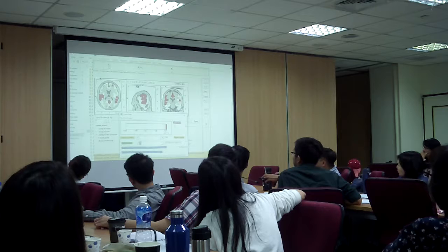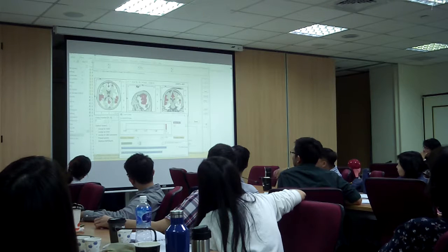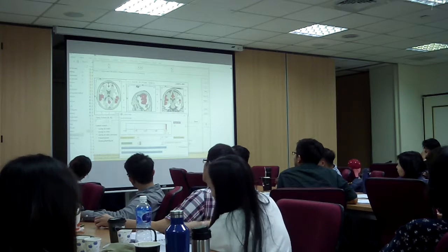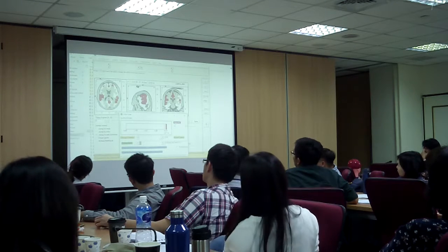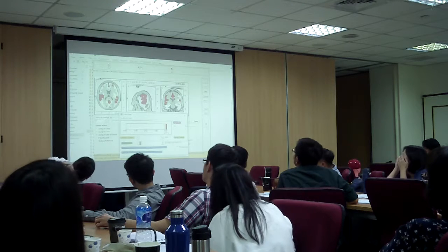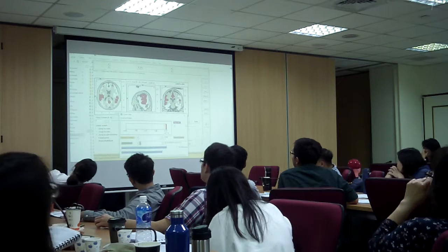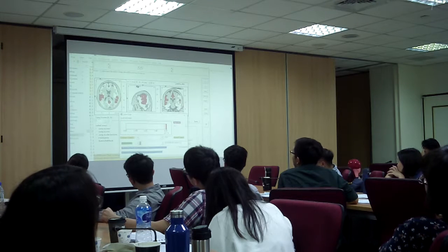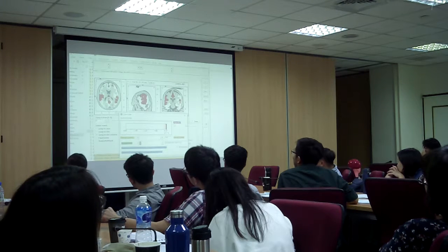And there we go. So we got the same on the other side, and we got the back. Now that's scaling it too much, but you have an idea of the networks that are compromised. So you look at connectivity, and that helps you decide on a more appropriate protocol.